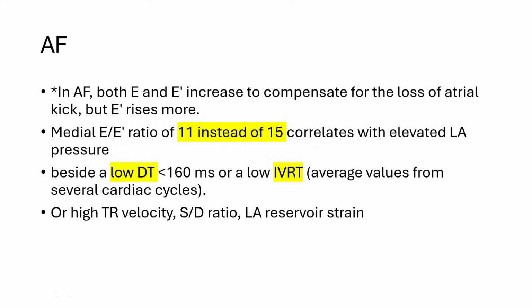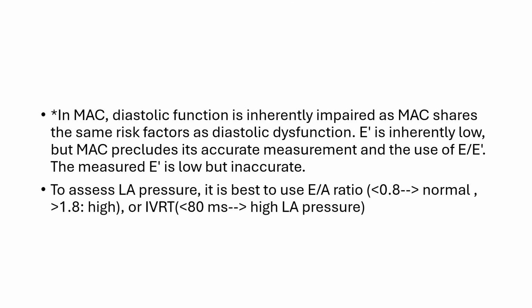And try to assess E to E prime ratio using nearly similar R to R cardiac cycle length for E and E prime. The other situation I want to detail is mitral annular calcification.